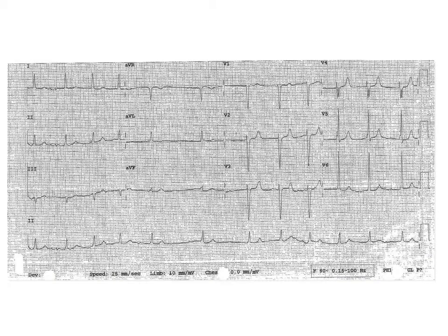Next one, is it regular or irregular at bottom? Irregular. P waves before each QRS? No. You've got AFib.